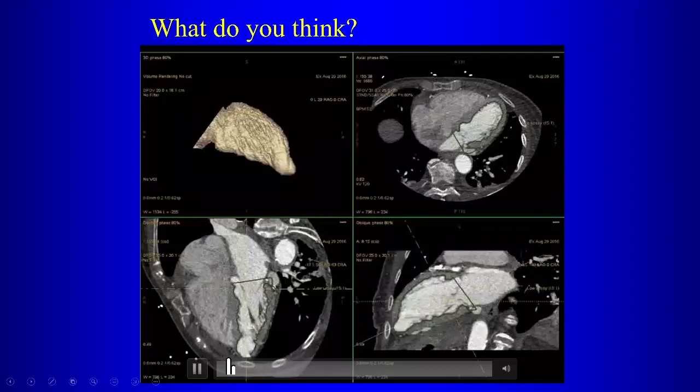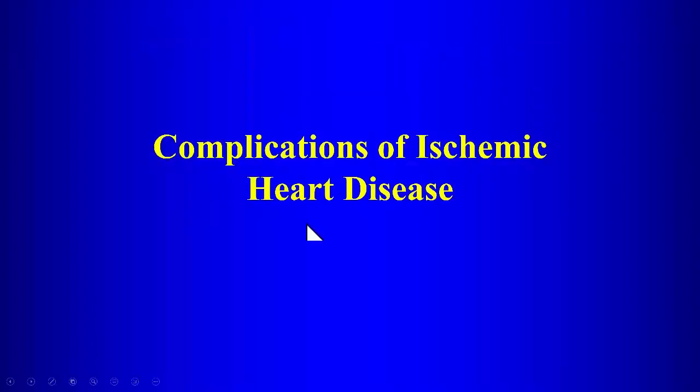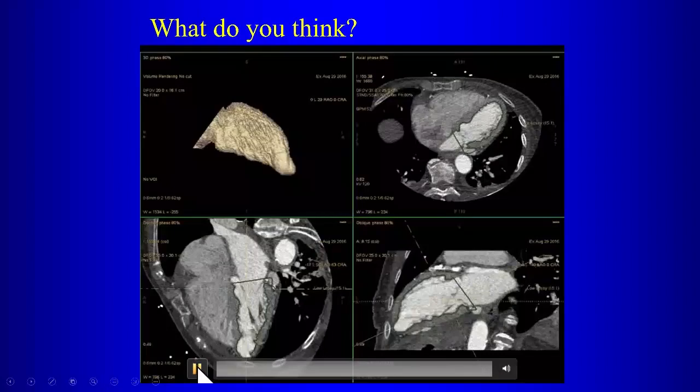I guess it's not showing up very well. It's not getting good wall motion there, but yeah, they're not moving. So let me see if I can get this to work. No, that doesn't seem to be moving.